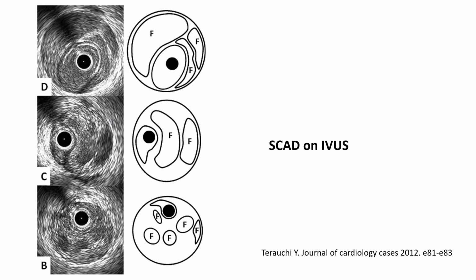This, on the other hand, is hard for me to tell it's SCAD. This patient here, they considered that SCAD with multiple pockets of intramural hematoma. As you can see, those dark pockets, it will be hard for me. To me, that could look like heavy plaque with echolucent area of necrotic core or lipid core. So I would have called this probably more unstable plaque than SCAD. But again, on longitudinal scanning, you will look for an area that looks like this, that banana well-demarcated structure.